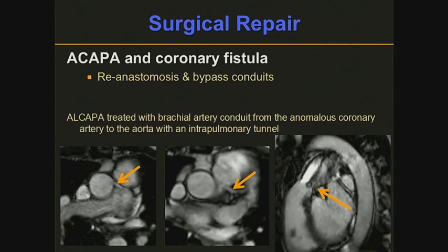This is a case we came across on MR. Here's the aorta, here's the pulmonary artery, here's the right ventricle outflow tract. We saw this dephasing jet, but the valve was normal. This was below the valve plane. We saw this rounded thing going across, which I follow along the course of it. It's going in this way. Going into the history, this turned out to be a patient who had the left main coming off the pulmonary artery in childhood.